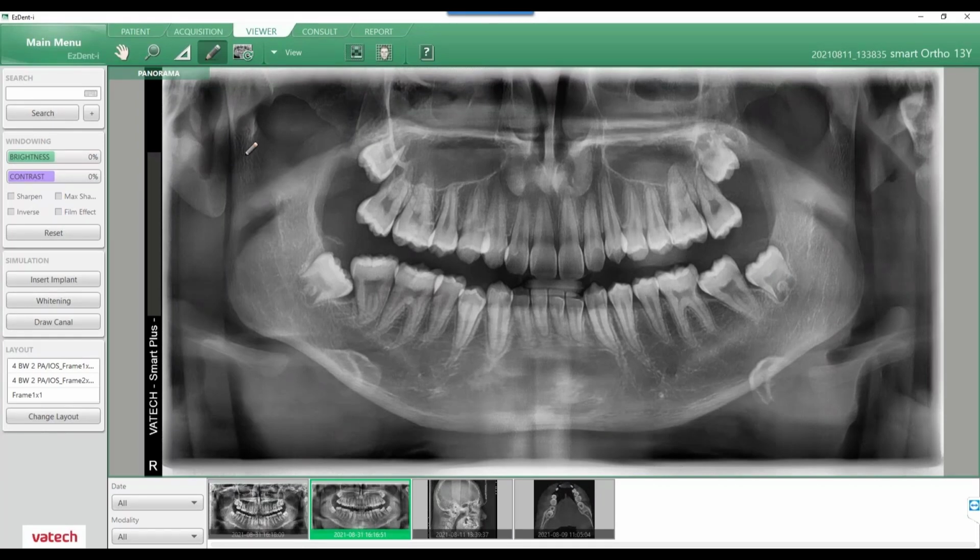I see something in the sinus, a little bit of translucency in both sides of the sinuses, just right off the bat. So you can take a look at that a little bit further when we take a look at the CT, and then also, we have our molars, impacted molars down there on each side, both sides.